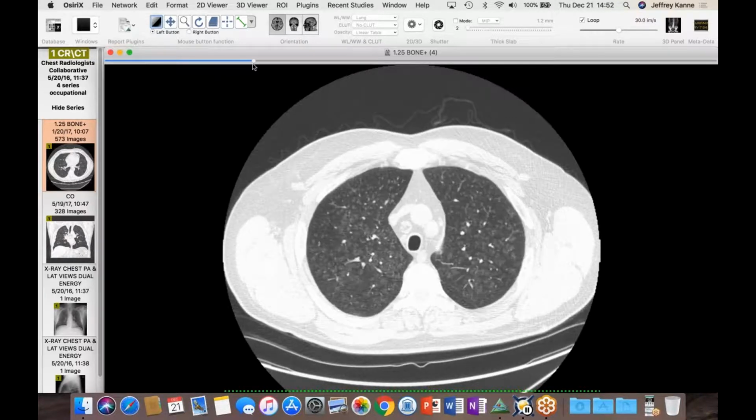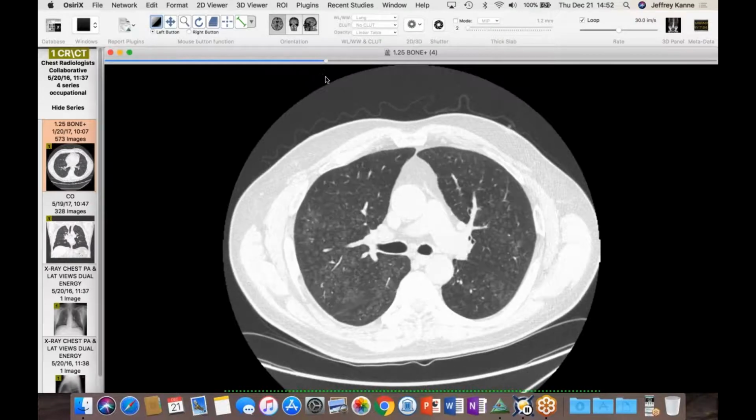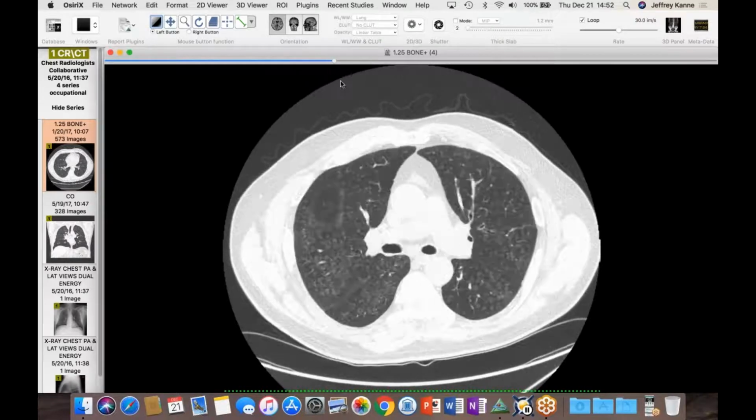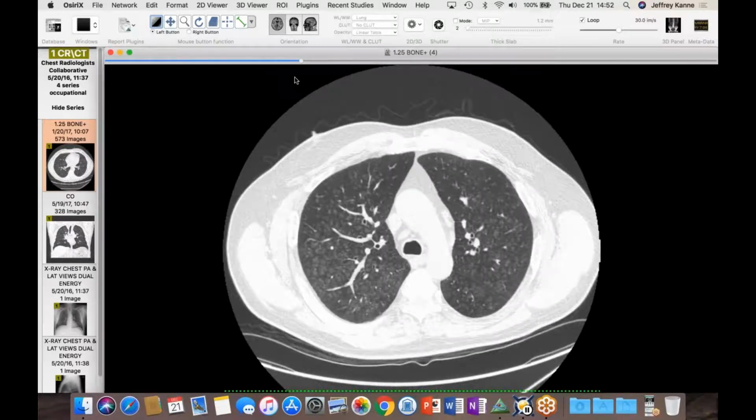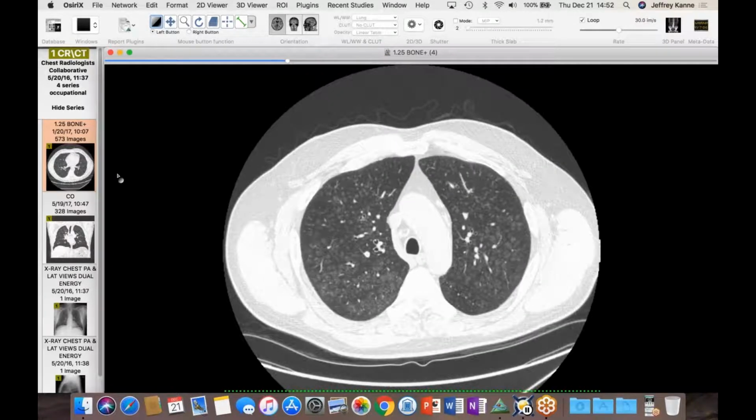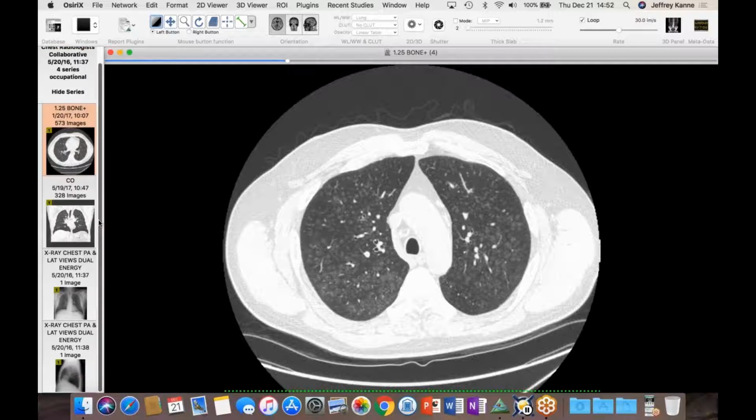They're usually very smudgy. Even patients who have a clinical diagnosis of RB-ILD don't usually have nodules this big, and you could almost excise these. It wasn't until we saw another scan on him and Doug asked the right questions, and the clinician who saw them had to actually go back and ask him. Turns out he was on disability, so he's working at a desk job, but when you find out what he was doing before that, it turns out he had been welding for many, many years.